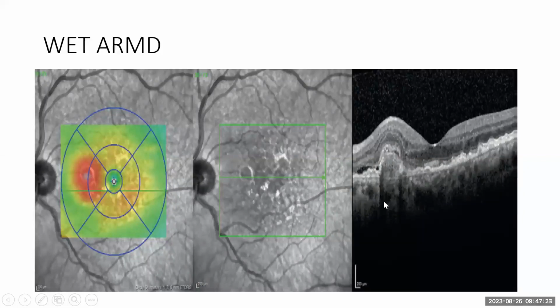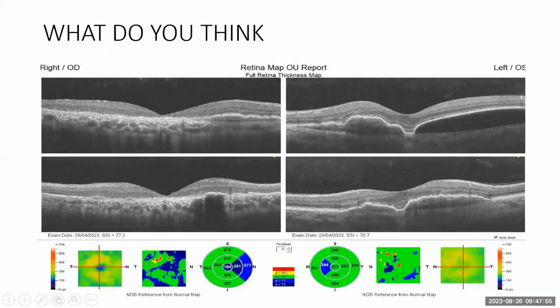This dark point, this and this, because of the neovascular membrane. And if you go all the other way, you see that the RPE is thrown into corrugations. This is by drusen. What you have here is drusen. They've thrown these areas into corrugation. So this thickening here is from the neovascular complex, the neovascular membrane in a wet ARMD.